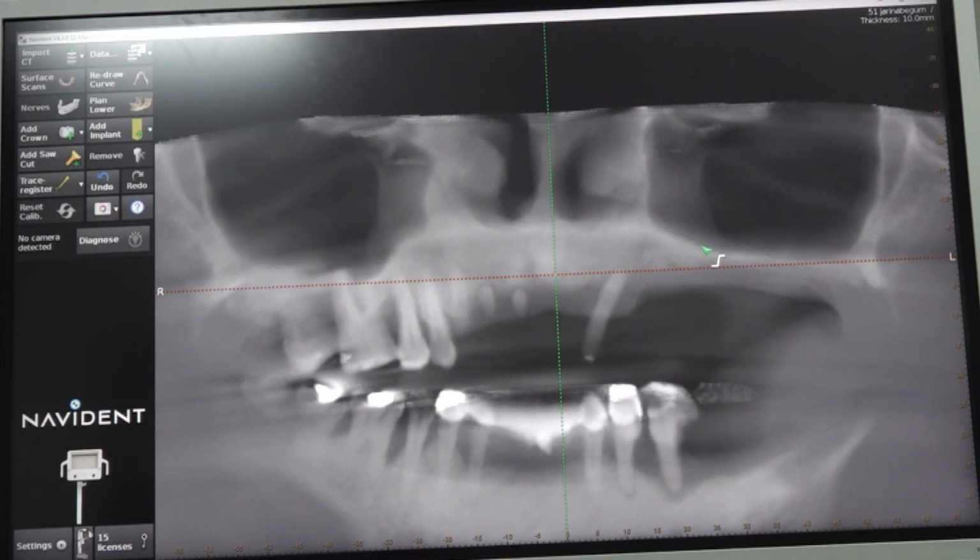See the sinus, no? It occupied the entire space. Right? So if you buy land, if you don't build a house, the other people occupy it. The same way the sinus is occupying from here to here, full stretch. Since some tooth is there, it is not occupying here. But here the entire nasomaxillary buttress is occupied. Even the pterygoid is gone on the right side. Right? Here, since the 8 is present, the sinus is respecting, it is not pneumatizing. But here, since the 8 is not present, it is going.